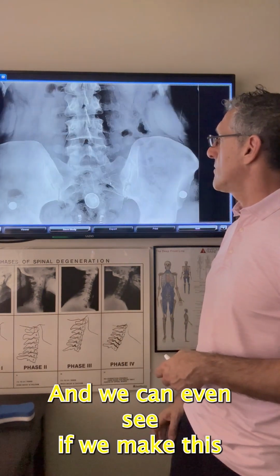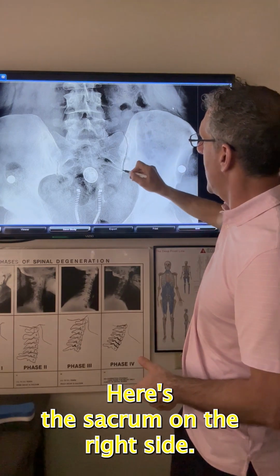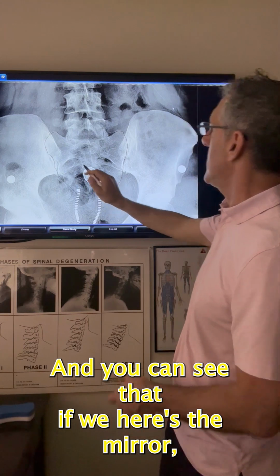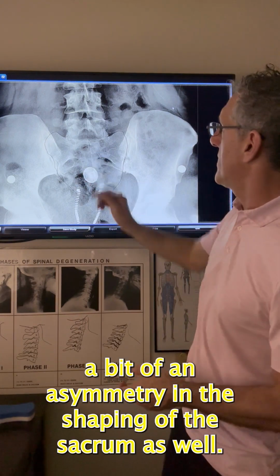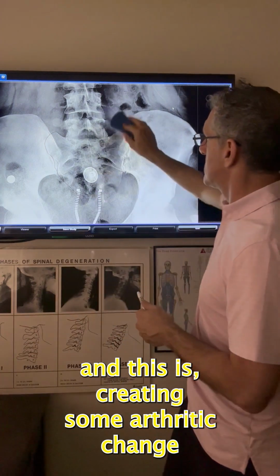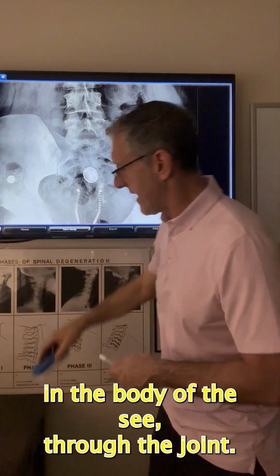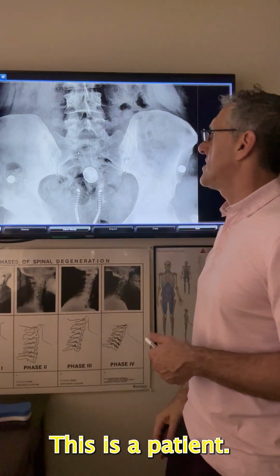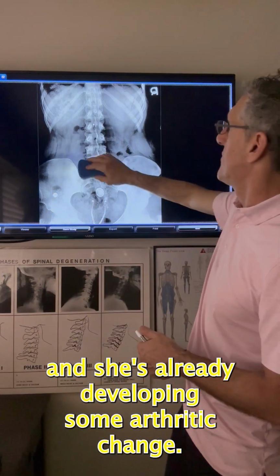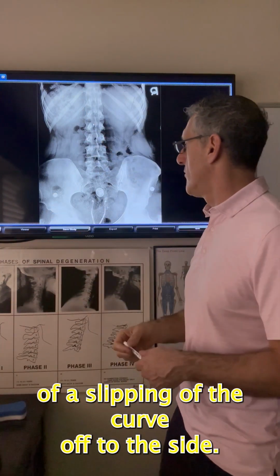And we can even see, if we make this a little bit larger here and I outline it, here's the sacrum on the right side, and then here's the sacrum on the left side. And you can see that here's the middle, you can see there's a bit of an asymmetry in the shaping of the sacrum as well. And this is creating some arthritic change down through the belly and the body of the sacroiliac joint. This is a patient, she's in her mid-30s, and she's already developing some arthritic change through that area. We can also see a little bit of a sloping of the curve off to the side.